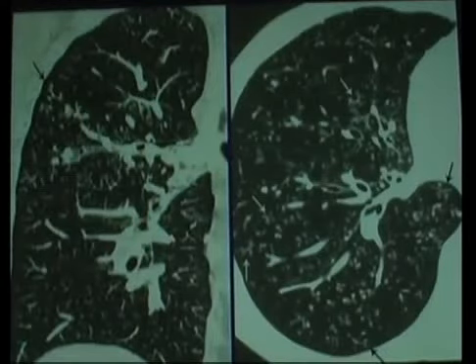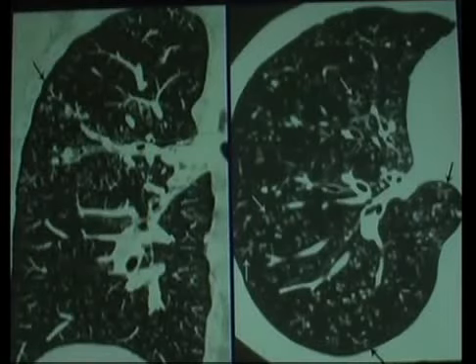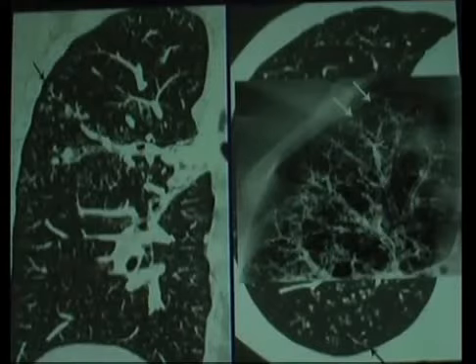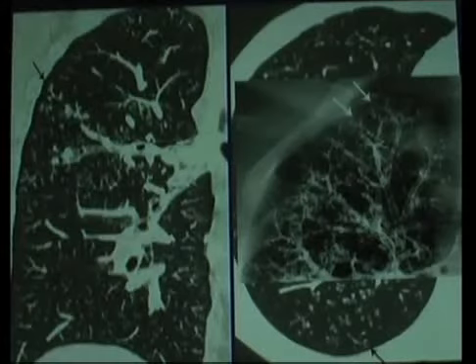So, you have sometimes some problem doing it on axial images. Coronal MIPs, coronal reconstructions, by the way, very frequently are helpful, because what might not look like a tree and bud in axial distribution, when you do a coronal image, unequivocally becomes tree and bud. Again, once you've learned to look for these things, they really just stand out. And these central airways, by the way, are a little dilated. And why do you see this pattern? Well, if you do a bronchogram, you'll see why. These airways don't reach the pleural surface and they branch. So you can imagine filling these guys up with secretions next to a bronchiole, next to an artery. That and that are the exact same thing.